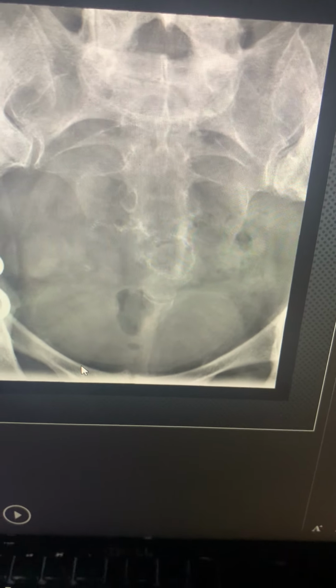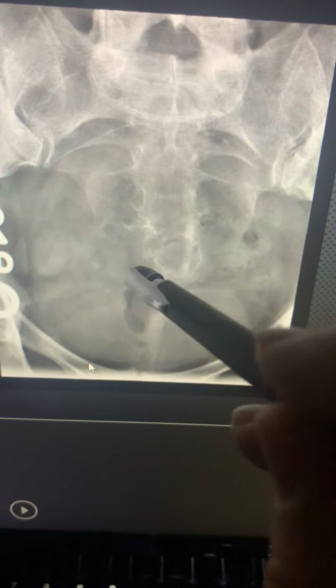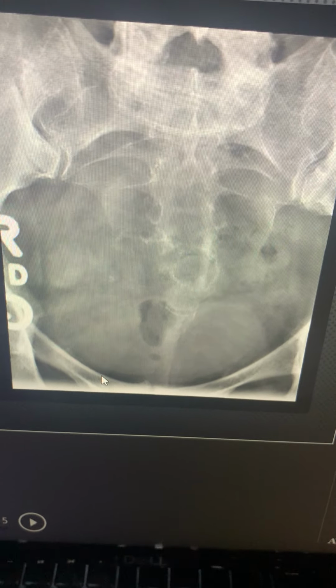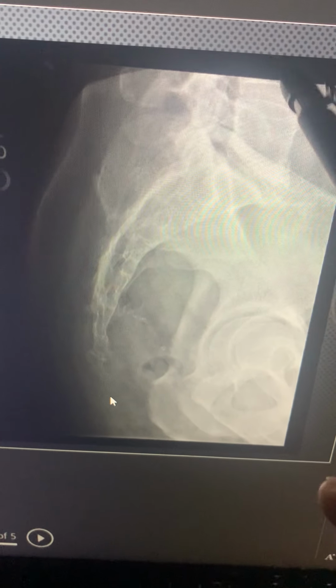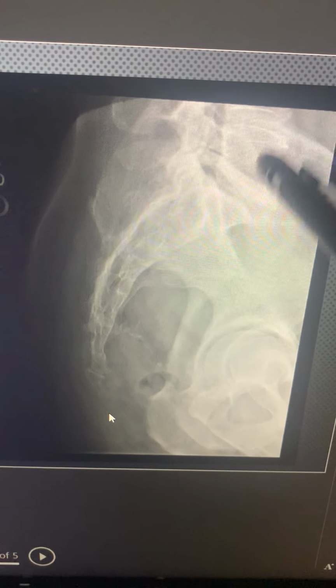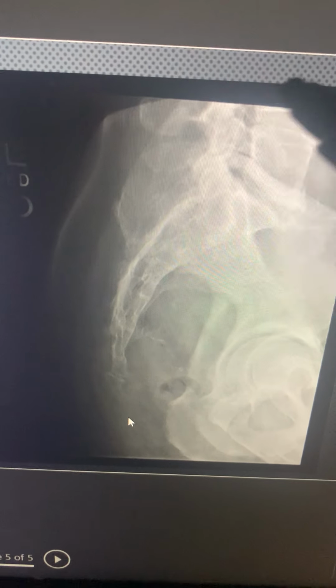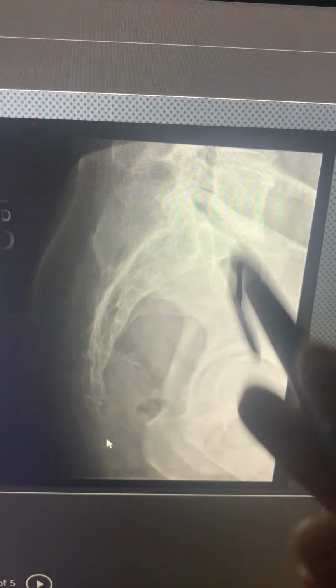This one could have been tighter, but it's a very small target, and I doubt I could have even gotten my marker in there. So that was as good as I could do. But for future reference, I could probably do tighter collimation. This one, I could definitely make tighter collimation, but they said just to leave it open. And I'm not going to argue with the technologist there, since if that's what they want, they can take it. And that's what that became.